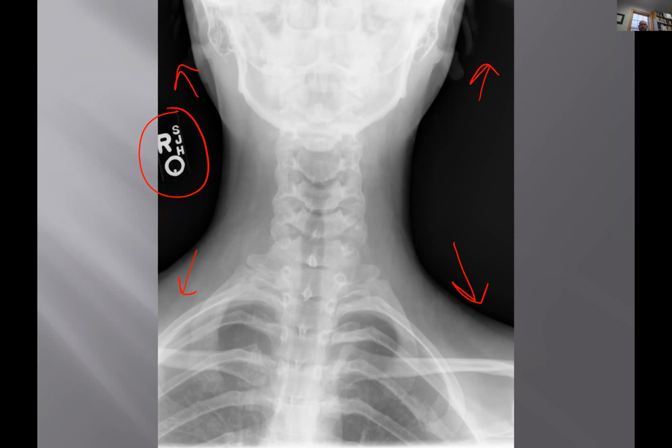If you see anything, let me know. And this was harder. You may not see it. I didn't see it till the very end of my report, in a little "not mentioned above, but also present" line in the impression. Well, the top left, something going on? Top left of the film, right up in here. Whoa. Yeah. Oh, let's go back here.